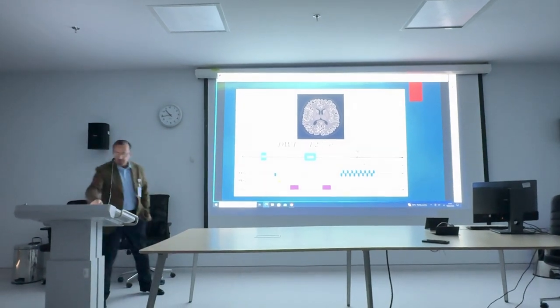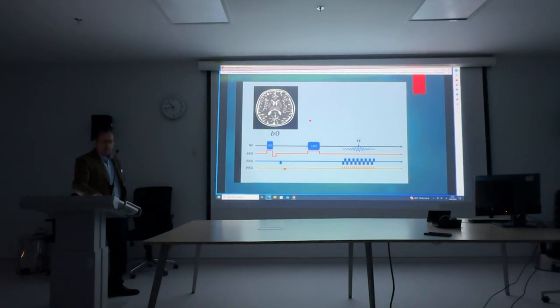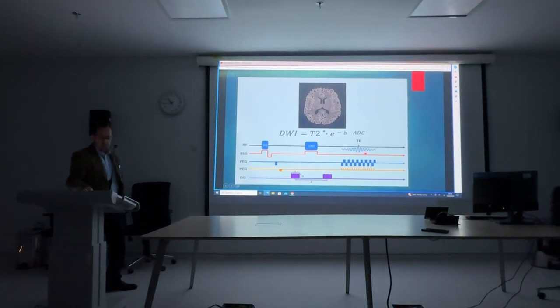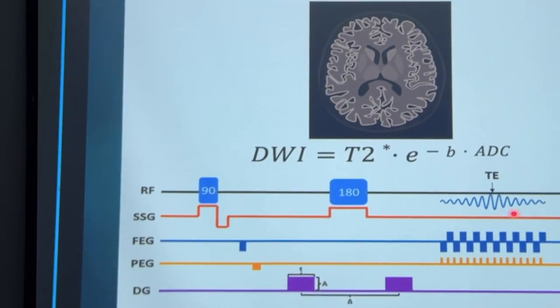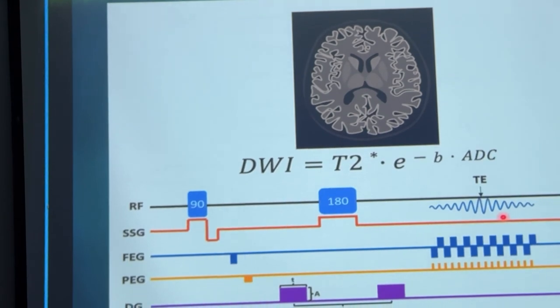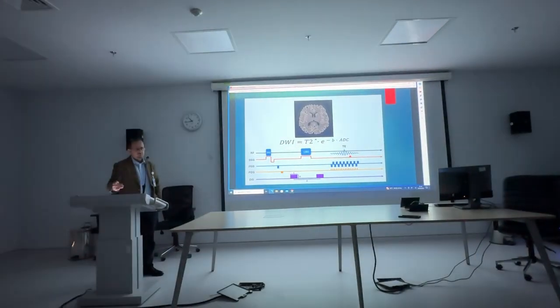We will make the signal in diffusion images darker. If you compare it with the previous one, the CSF in the ventricle is bright. By applying this sequence, it becomes dark. All the gray matter and the surrounding tissue of the parenchyma of the brain appear gray compared to before, as they achieve a loss of signal.